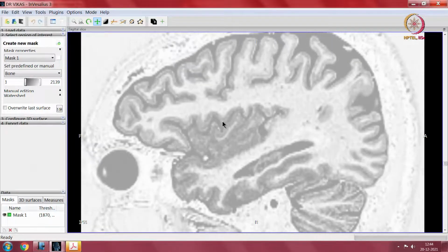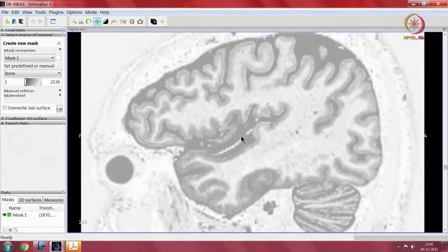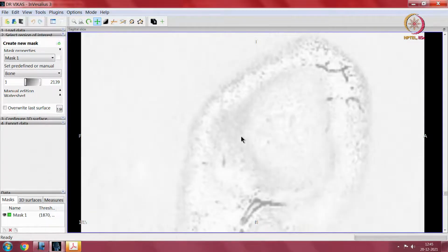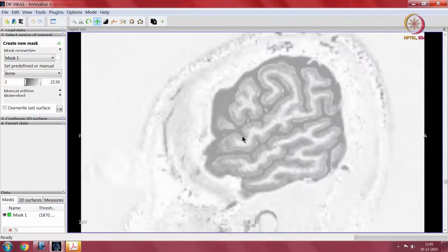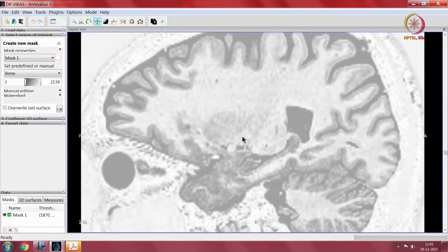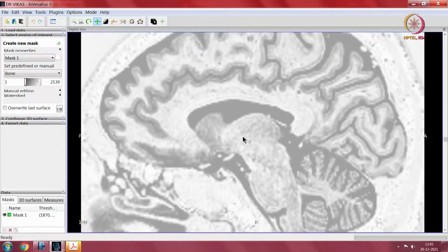We need to identify the insula. So, the insula is this. You can see white matter all around, indicating deep within the brain matter, and suddenly you see gray matter over here. So, gray matter with cortex, sulci and subarachnoid space. This is subarachnoid space. So, that is the insula. That is about how you interpret structures. These are very broad structural descriptions, but it is to give you an idea of what is situated where and how these things look.